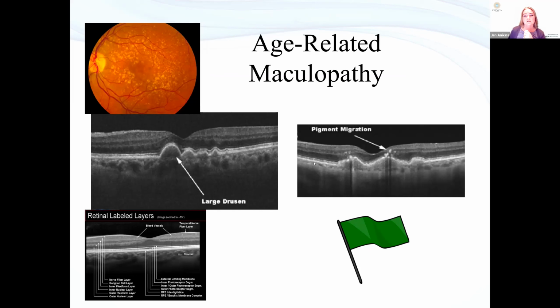Why refer to a low vision clinic with drusen? Because a low vision clinic tries to maximize the vision they've got. And patients with this drusenoid picture, like what we've got on the screen now, can actually have visual impairment. I saw a lady today that precisely had this picture, and she was 6/12. Some people manage very well with that, but some people are quite symptomatic. So I still might refer if they were having significant problems. Even without significant geographic atrophy, you can still have visual impairment from AMD.